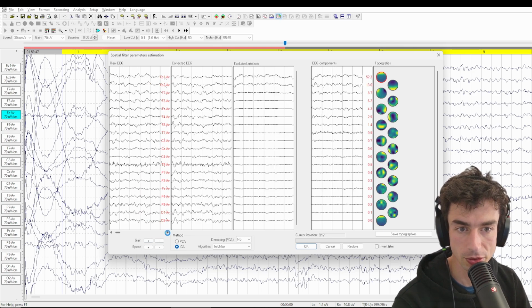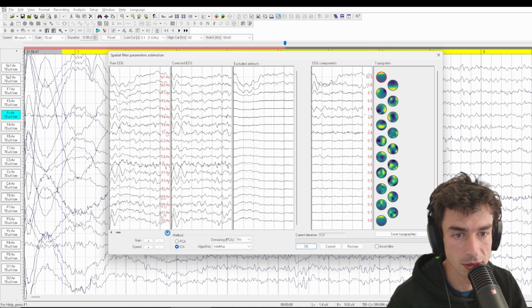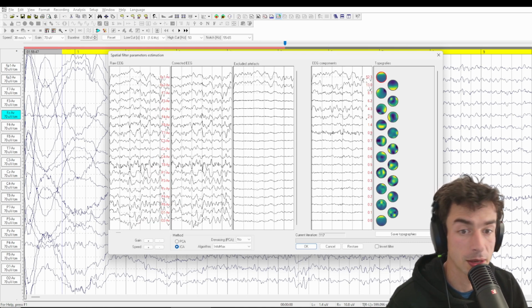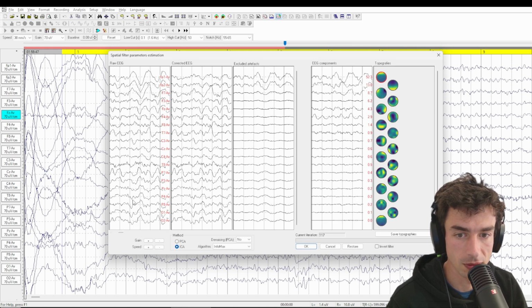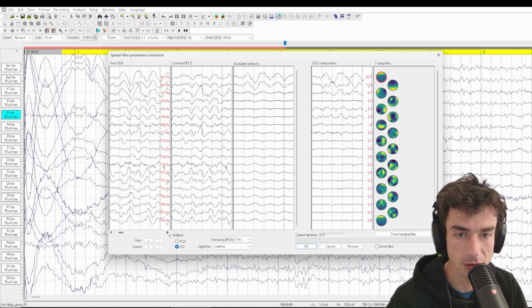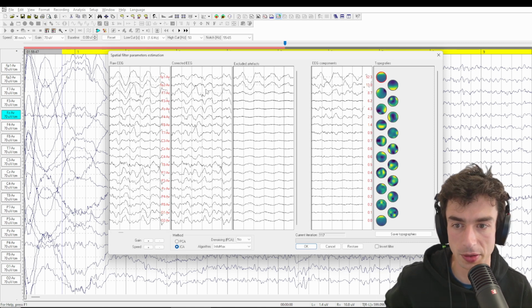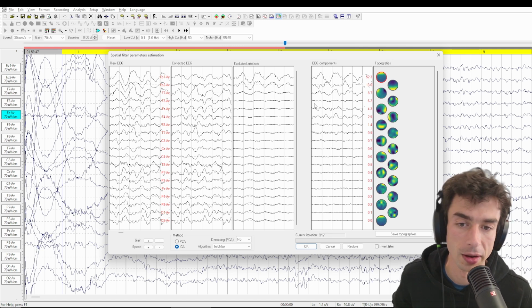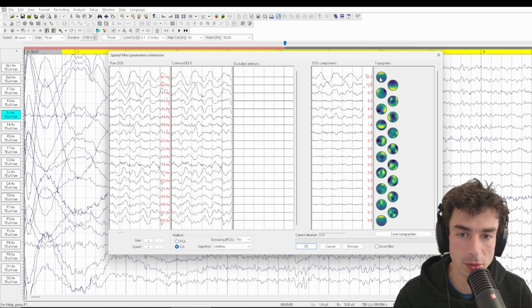And we're just going to scroll through to verify that we're not removing any genuine EEG activity, especially given how much clinically relevant frontal midline theta there is. And we've jumped to a good portion of the EEG for that, because this is where there was some of that happening. And unsurprisingly, this topography, if we remove it, will be removing some of that activity.